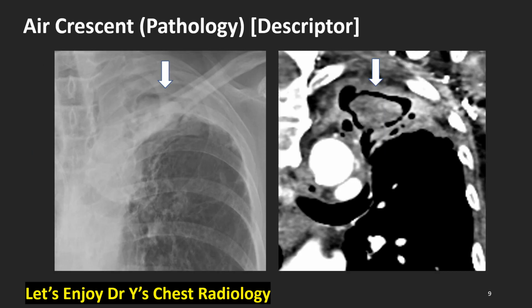Air crescent, pathology, descriptor. The arrows indicate the air crescent in a mycetoma patient with an underlying tuberculous cavity.